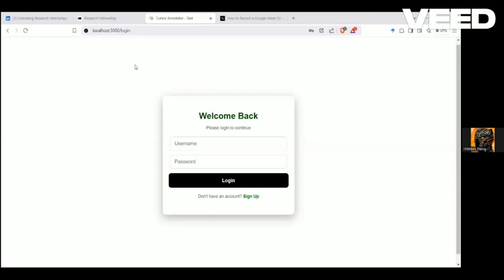So the app that we have built during this course is Brain Imaging Annotator. So this is the login page for the Brain Image Annotator, and we have options of sign in and sign up. So let us look at the sign up option.